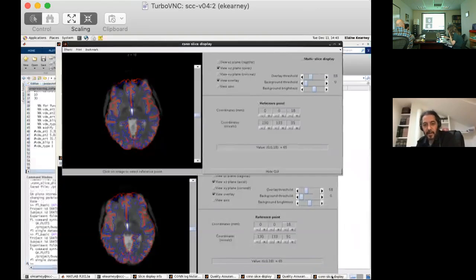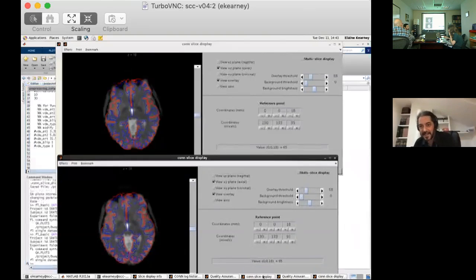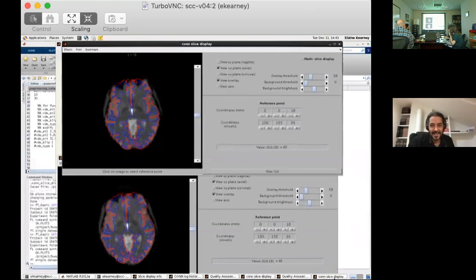Well, perhaps it's good that we don't know which one is which. Let's try to figure out which one we think is better, and then we'll figure out which one is which. Good job. No, remember you pulled up the old one second. You can tell from the file info, but perhaps we should do it blind and decide which one we would call better without knowing which is which. Might be a good practice.